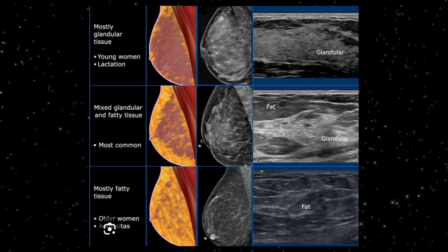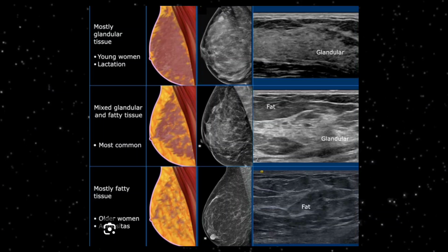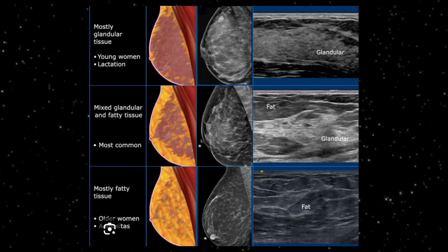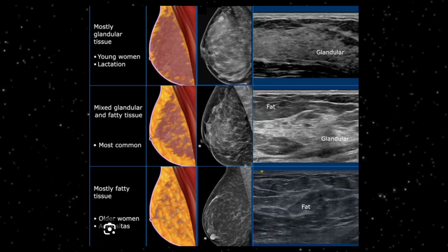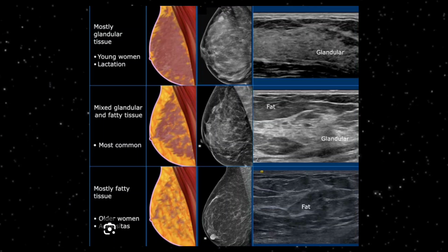In the lower image you can appreciate that this breast is replaced by fatty tissue, because it is seen in elderly patients, in whom the glandular component is replaced by fatty composition. Under ultrasonography this usually has a flaccid appearance, with a slightly hypoechoic pattern of the breast tissue.